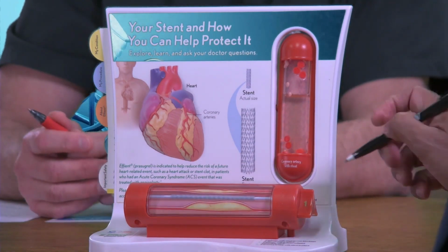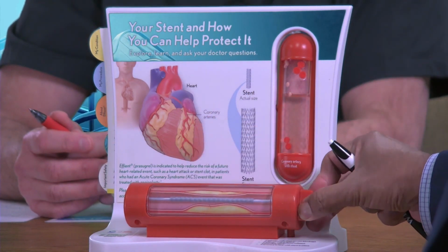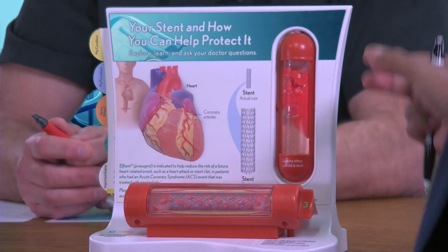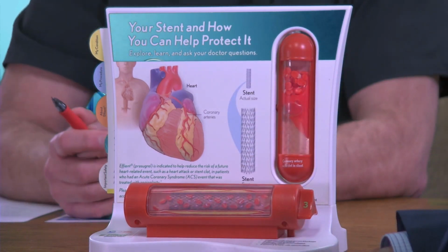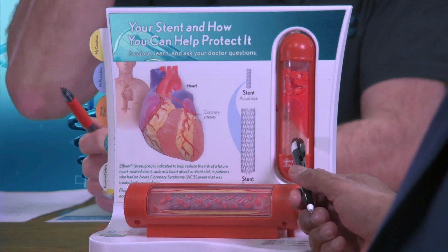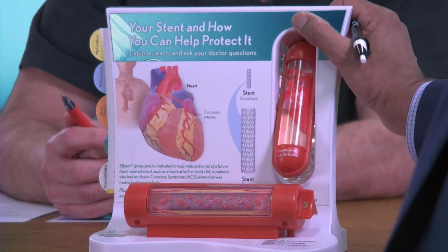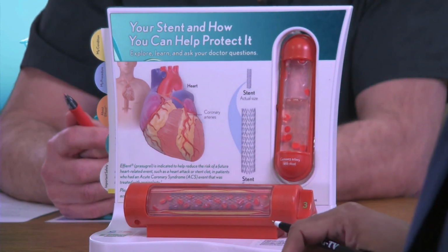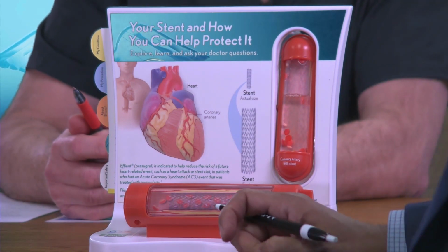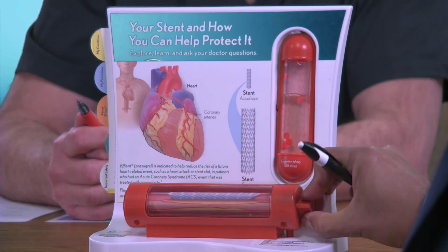Yes. And this is our wire over here, and there's a stent on top that when we expand, it gets delivered just like this, and it opens up the artery. Okay, so the model on the top right shows us that it's a clogged artery, correct? There's a clot in the artery. Yes. And those are blood cells that are falling down in there, right? Yes.